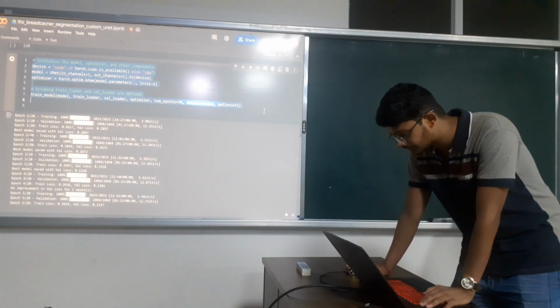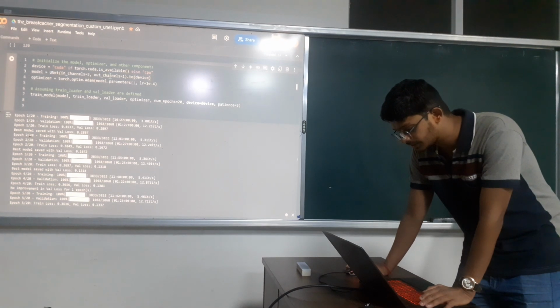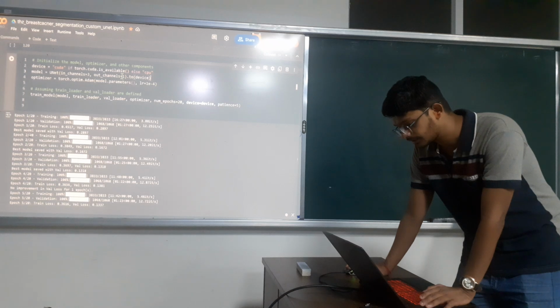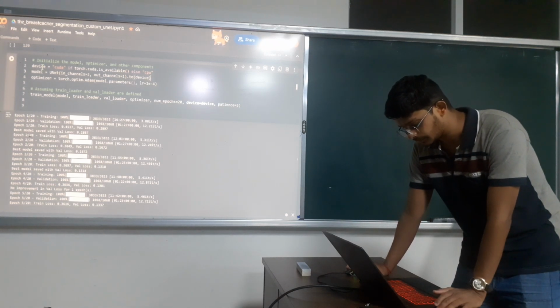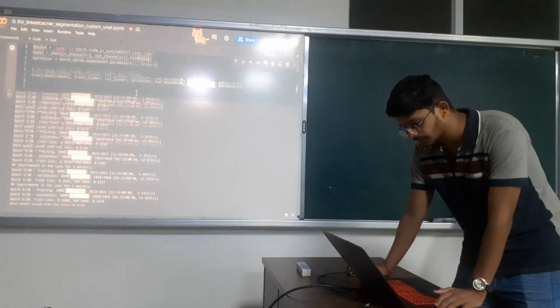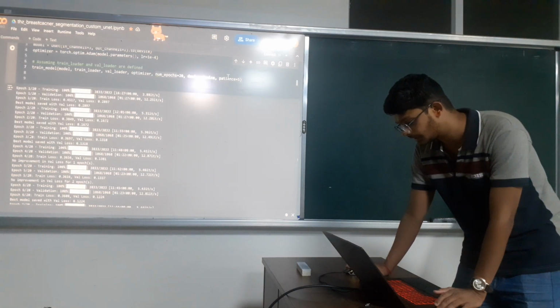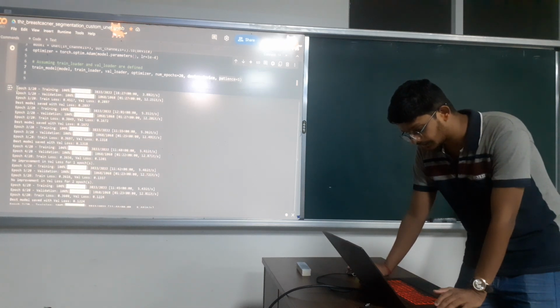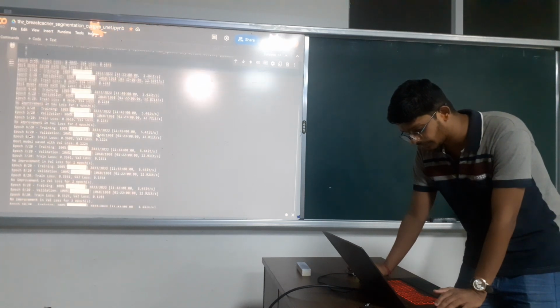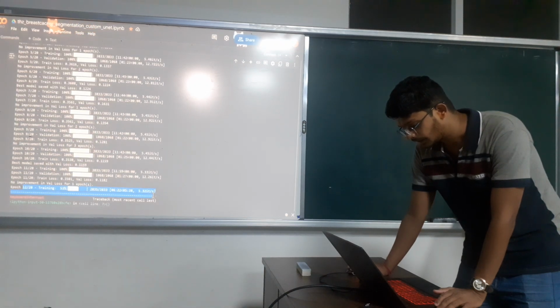So this is the instance of the whole training loop, and this is the model. I am calling the model with UNet in channel 3, out channel 1, because the out channel should be 1 with the generated predicted mask, and this is the device agnostic code. This is the learning rate, and this is the model calling with the number of epochs equal to 20, patience equal to 5. As we can see, the whole set I've shown with the progress bar, and the total number of epochs that it ran to is 12 out of 20.